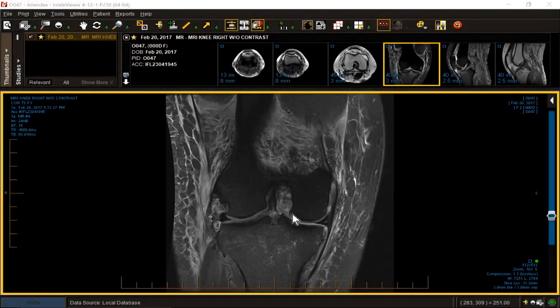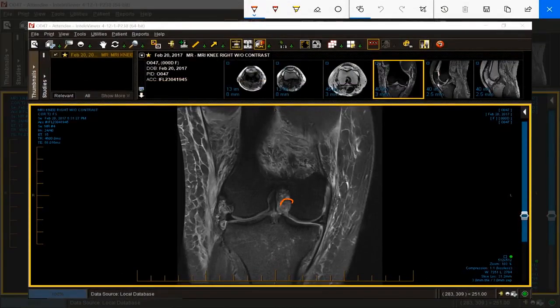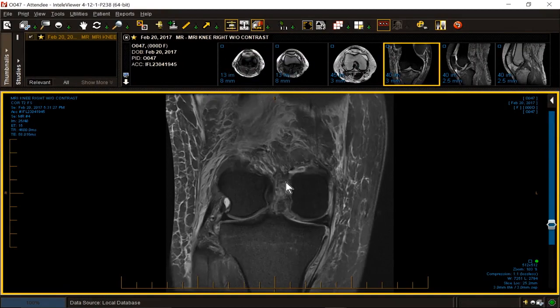We look inside the PCL in the coronal projection to diagnose a PCL tear, because the PCL is often swathed in a very thick sheath. And if that sheath is inflamed, the PCL in the sagittal may look very gray. So you go to the coronal and you look inside the circle. So here's the circle. And we should have black inside the circle. We don't. That PCL is going to be gone.